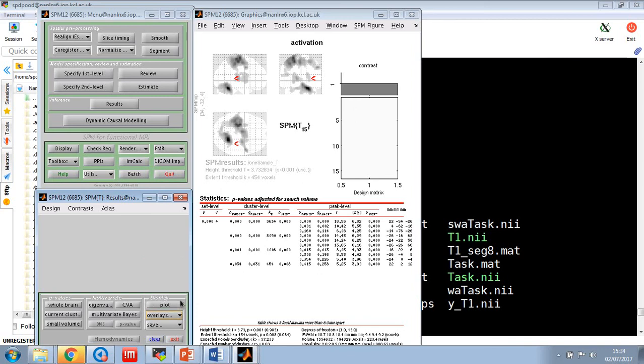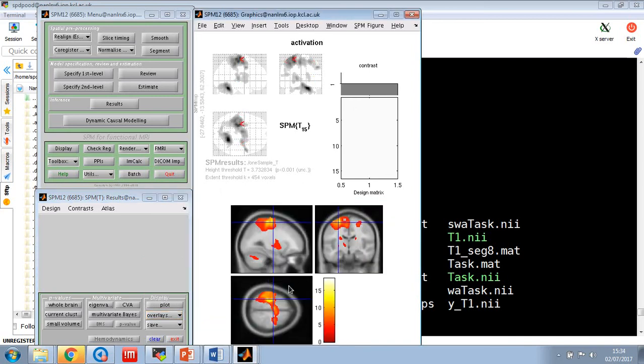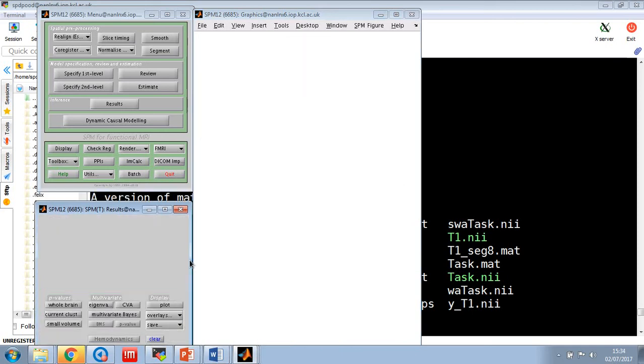Okay. So previous sections. Right. So hopefully that's very clear. The last thing we'll do is, let's say you want a specific hypothesis you want to test. You want to test whether the basal ganglia is recruiting, and we can see it is, but let's just test it anyway. So we'll go back and set thresholds uncorrected.